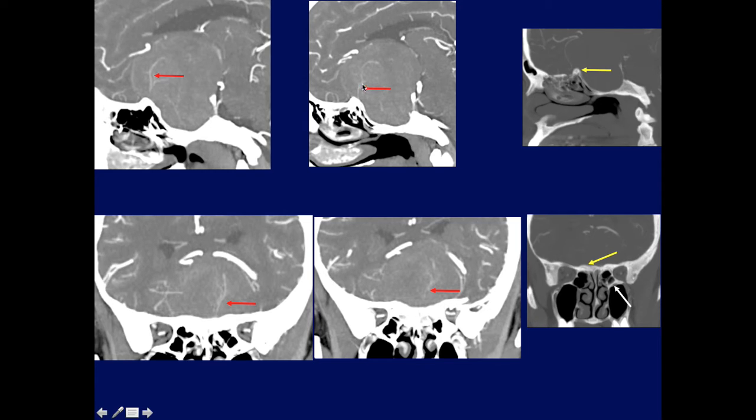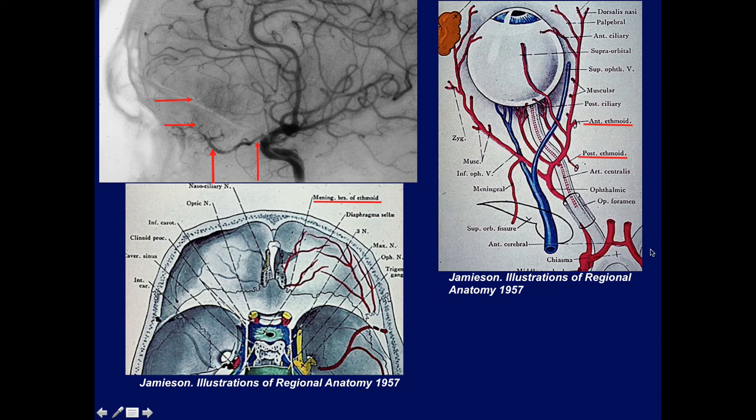these vessels here. See these vessels I've talked about many times that supply meningioma, and in this case, remember I showed this last week, that expanded ophthalmic artery showing the supply of meningiomas in the floor of the anterior fossa. Because these are ethmoidal branches coming off the ophthalmic artery.